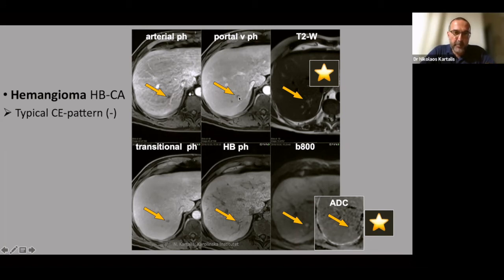If we are very careful, and try to point that out during the case interaction, you see that there is probably some enhancement, and the lesions become smaller in size. The lesion is probably not diminishing because of biological phenomena, but because there is some enhancement in the periphery. Unfortunately, Primovist is 1/4 of the amount of the extracellular contrast, so we don't always find this beautiful enhancement in the periphery.